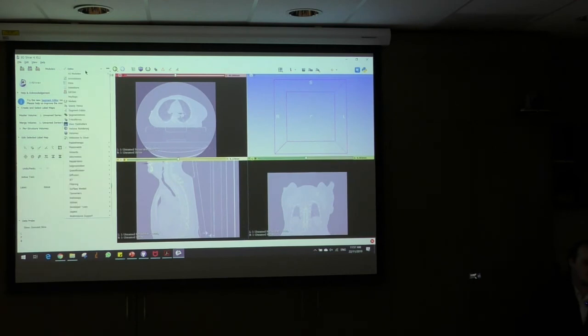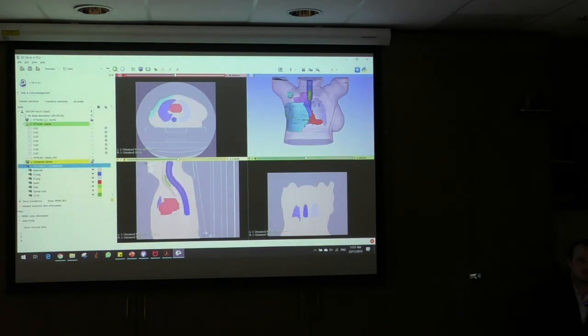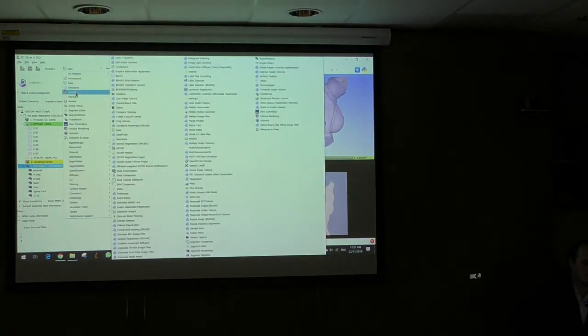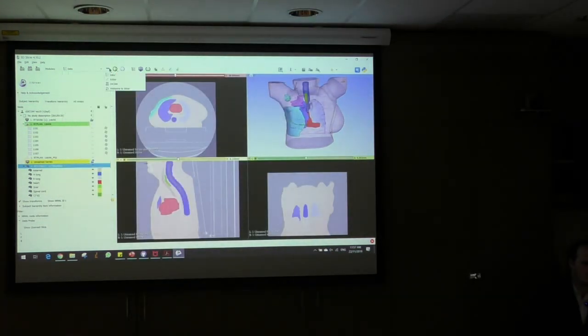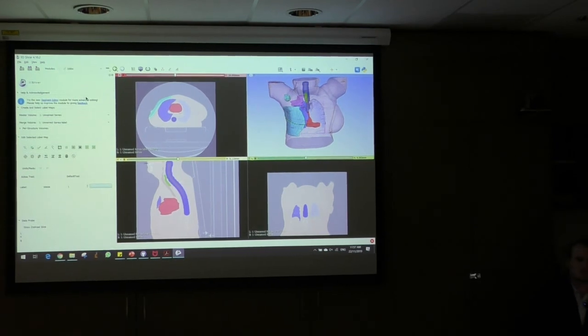And so what you saw earlier in the data tab, all of these are the contours of the patient, which you can create yourself in terms of what we need it for. This little function here allows you to go back to a previously opened window, for instance, the editor, the contour, the segmentation.